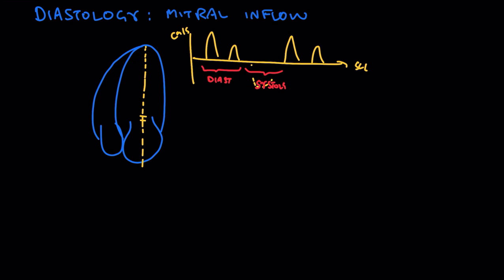Well, a healthy pattern looks something like this. It looks like a good amount of blood flow early, and then a fair bit of blood flow late. So some early and some late in diastole, like what I've drawn. And let's say this is 100 centimeters per second, and let's say this one is 50. Note that this is much more; when we were talking about tissue Doppler in another video, and E prime, we were looking at values of 6, 7, 10. This is much more. It's blood flow, right? The blood flows at a much higher velocity than the tissue moves. So this would be considered a normal filling.